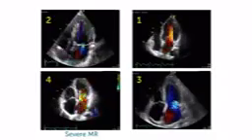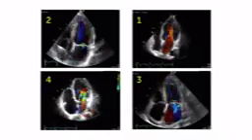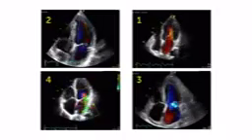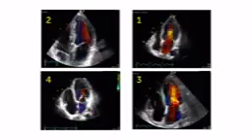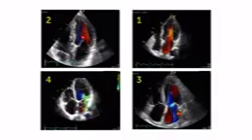Remember, in this case, we probably even underestimate the severity because it impinges on the left atrial wall. And the important finding here is that of a very large flow convergence zone. Also compare the flow convergence zone from this patient to this patient. Here it's barely visible, maybe very small. You definitely don't even see a flow convergence zone in this case and in this case.